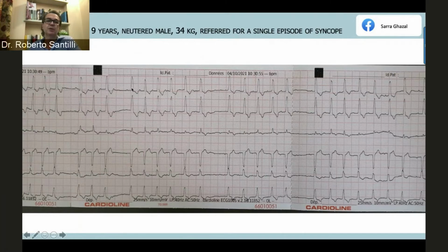So in our experience, when you have a normal axis on the frontal plane, this is a left bundle branch block. So as soon as you see a left bundle branch block, now we have to say if it's a complete one or pre-divisional, so before the bifurcation in anterior and posterior fascicle, or is this an incomplete left bundle branch block, so more post-divisional, so after the division.